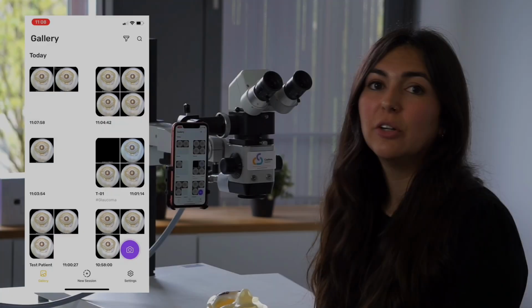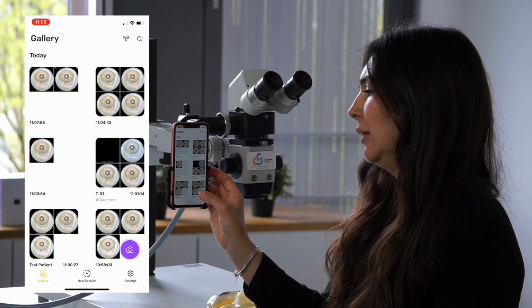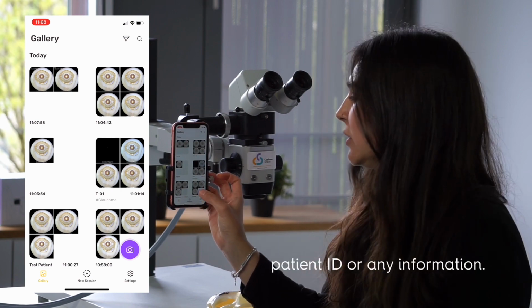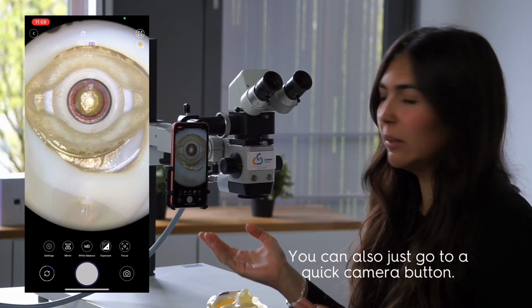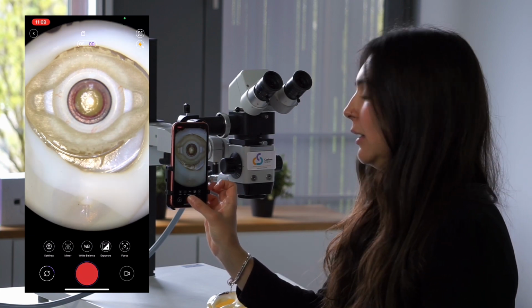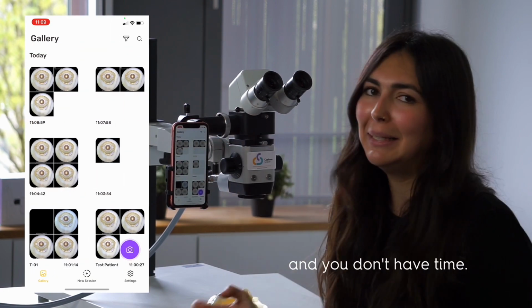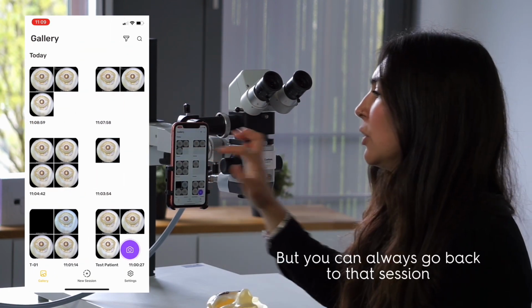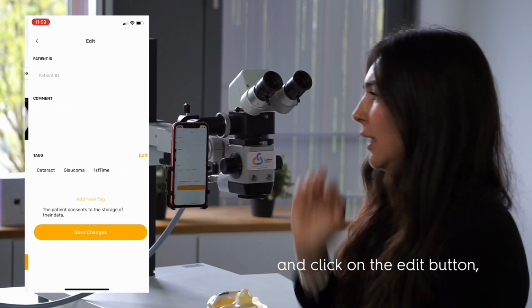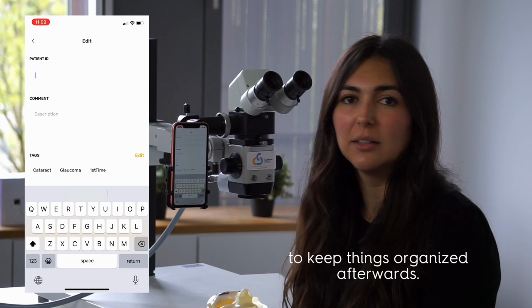So yeah, make sure you use it. It's really useful. If you're in a rush and you have to take pictures quickly, but you don't have time to add the patient ID or any information, you can also just go to the quick camera button. So basically take pictures, take videos, do whatever you have to do. We know sometimes things happen quickly and you don't have time, but you can always go back to that session and click on the edit button and add any information that you want to keep things organized afterwards.